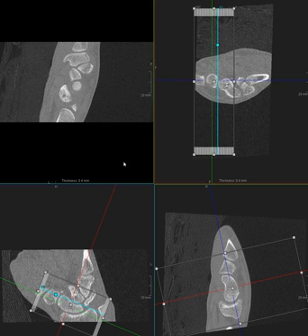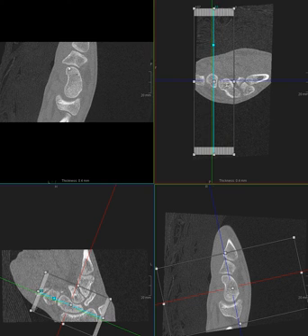That's what they're looking for when they ask for dedicated scaphoid images, and that's what we've been including on our routine CTs of the wrist.